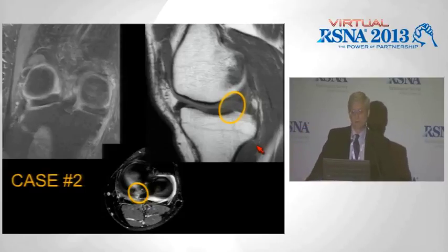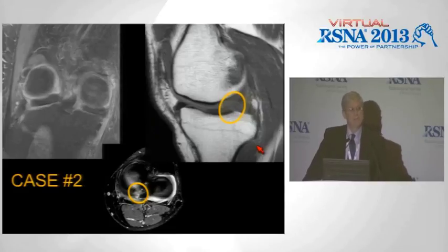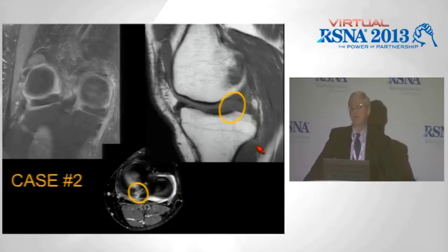And it still should look like a pretty good sideways triangle, and the circle is on my sagittal images where that posterior root is abnormal, because I should see meniscal tissue on that image. And I actually find axial images very helpful often for meniscal tears, because it won't show me the tear, but it will show me the morphology, what type of tear I am dealing with. And we can very nicely see this radial type tear in the posterior horn of the root of the meniscus.